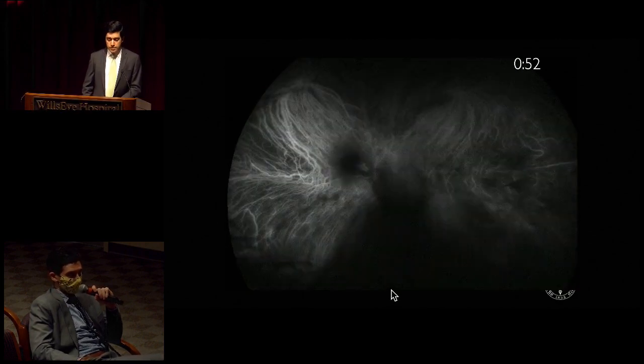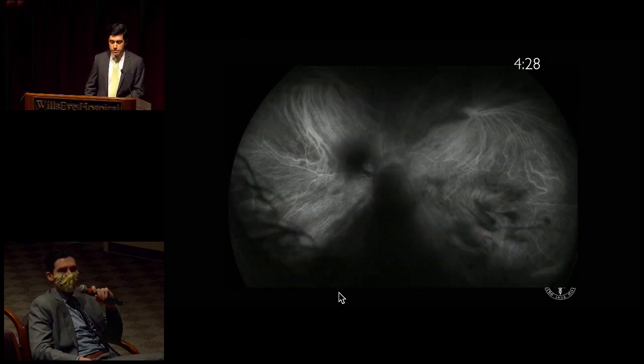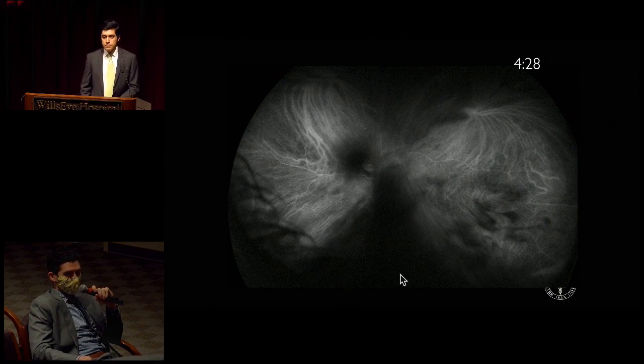This is an ICG angiography, I'm assuming of the left eye, given all the media opacity here. Overall, the choroidal filling looks good. There is, again, some blockage in this area that was suspected to be subretinal hemorrhage. And there is some slight hypercyanescence right at that focus that we were suspecting might be intraretinal, but no polyps or other deep choroidal lesions. And late frame, 4 minutes, 28 seconds, again, we don't see any prominent polypoidal-like leakage in this area.